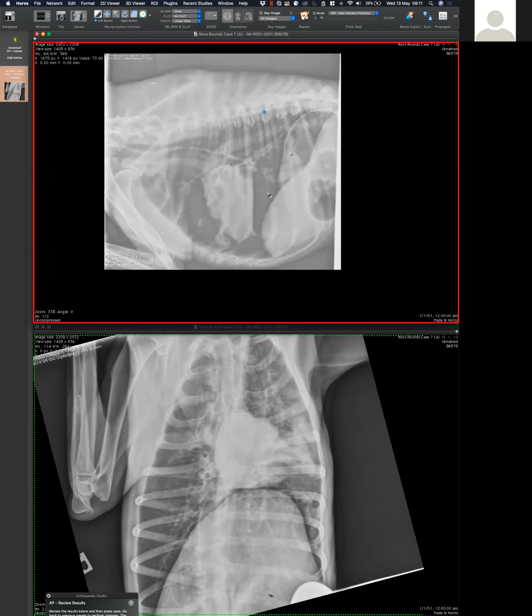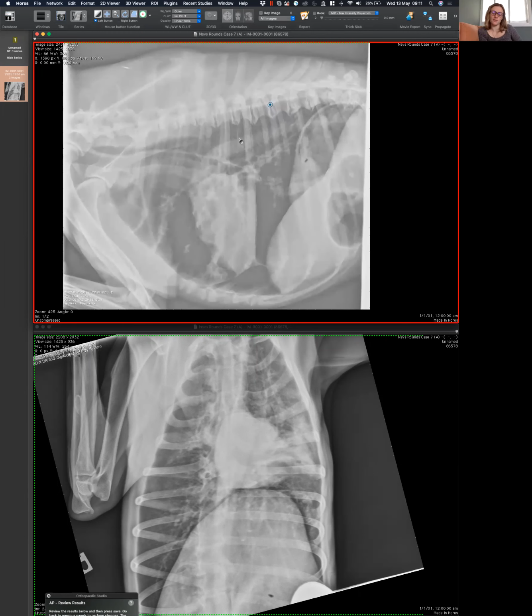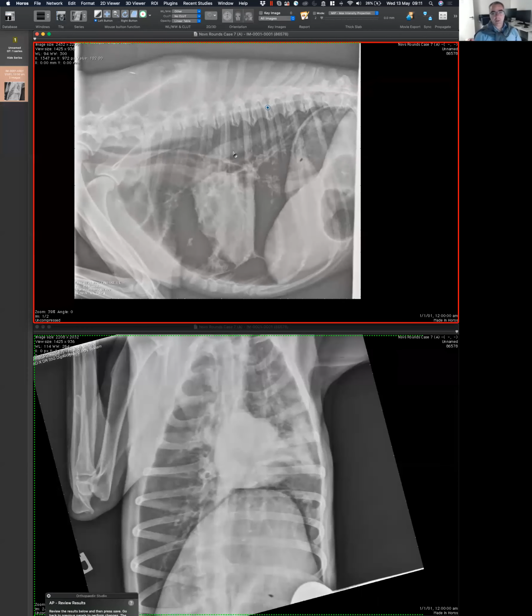There are actually quite a few images from this patient on Keystone, so it might be one that was taken a little bit later. Good point. That's why I decided to start with these 2, because there is a lot to talk about in these 2. Then we can go back to what happens in the follow-ups. If you open the link that I sent you, even if I try hard, I don't think I can bring that back to a normal exposure. But let's continue with the findings.